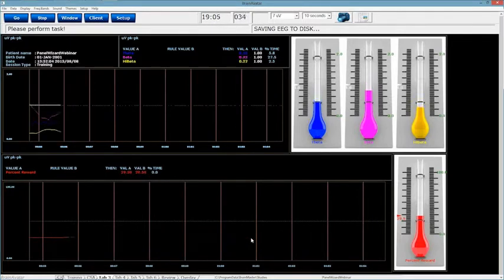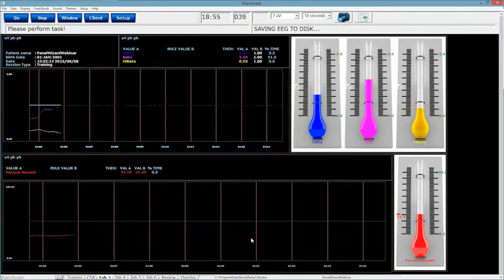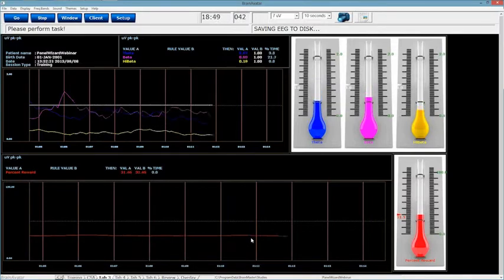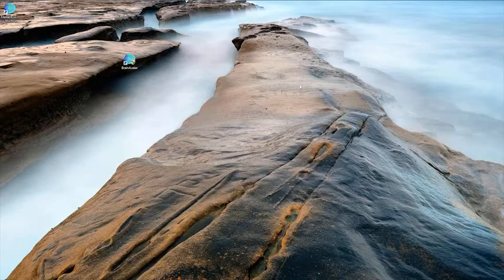Now, the most important thing, and this is something that I can't stress enough to you guys, is that after you've done all this nice hard work in making something that is going to work for you, and you put your blood, sweat, and tears into making this design and making it perfect for you and your resolution, save your results. All right? So I'm going to stop the software. I'm going to close it. I'm going to open my software again.